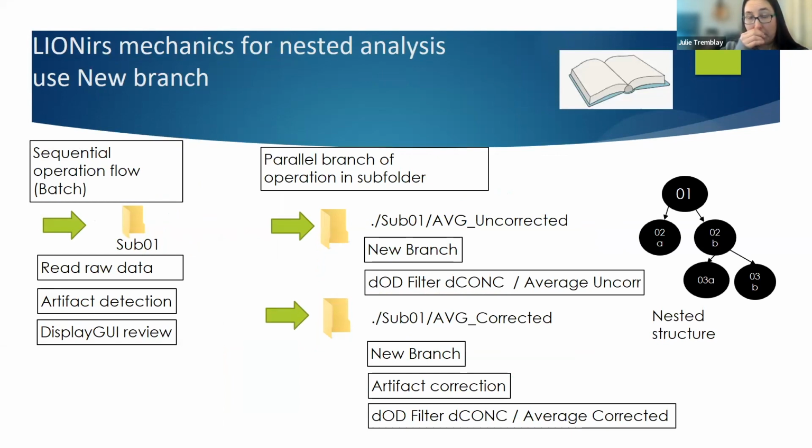So this part is a bit technical, but important to understand if you wish to use the toolbox for your analysis. As I mentioned previously, the SPM batch processing applies the operations in a sequential workflow. So at any step, you can stop this workflow and visualize your data in the display GUI to review and eventually modify the artifact detection.